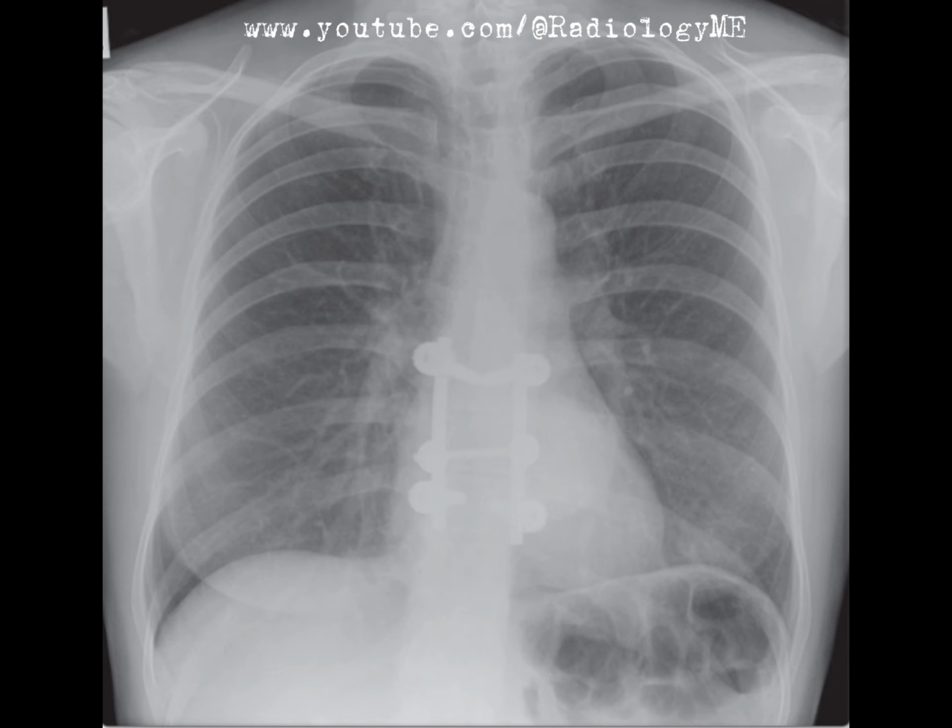The examiner might ask about how I would differentiate between a nerve sheath tumor and something like an abscess or metastasis. In that case, I would explain that the clear, well-defined margins and enhancement pattern, along with the patient's history, really help steer us toward a neural tumor. If this were an abscess, we would expect more ill-defined margins and perhaps signs of infection elsewhere. Metastasis would more likely present with destructive features or multiple lesions.